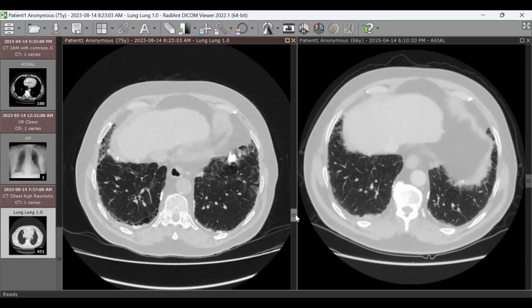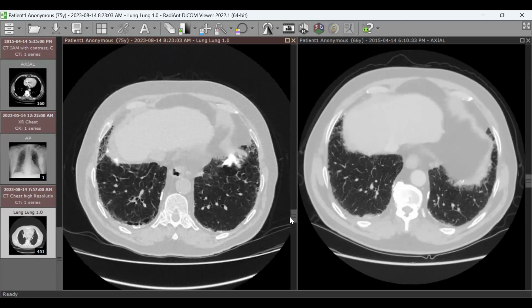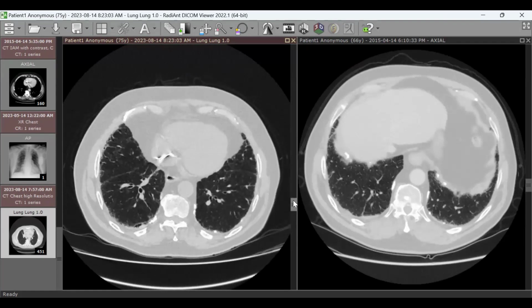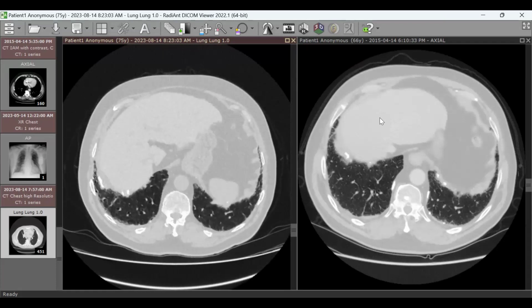Because it's important. If the patient has asbestosis, this means that he needs to get compensation, and he can sue the place where he used to work. So it's a legal issue too, but it is asbestosis definitely, and probable contribution of amiodarone toxicity. For the liver, this could cause only an increase in the liver enzymes, but definitely if continued on amiodarone, he might have cirrhosis in the future, like a full-blown picture.